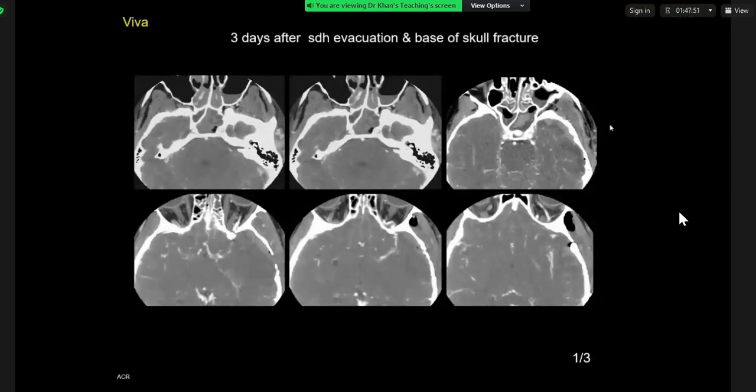Okay, so selected axial CTA slices. Having a look at the left superior ophthalmic vein, it appears slightly expanded and enhancing, which would make me think of a carotid cavernous fistula. Having a look at the cavernous sinus now, I think there's possibly some gas locules in the expected area of the cavernous sinus, and the left cavernous sinus is slightly bulged or expanded.